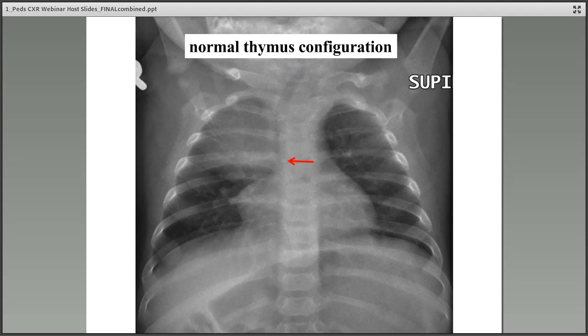With the enlarged thymus on the right and the buckled trachea, the impression is that there might be atelectasis involving the right upper lung, but this is not so. This is only secondary to a very low lung volume.